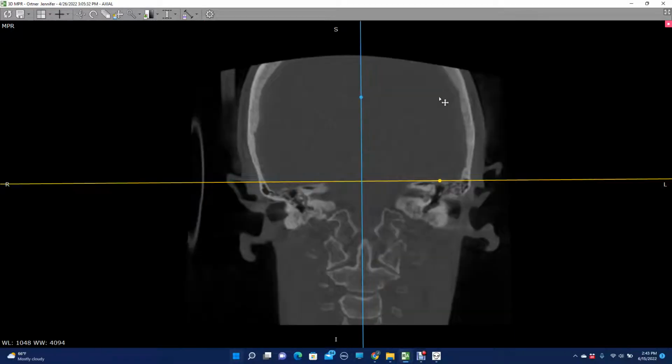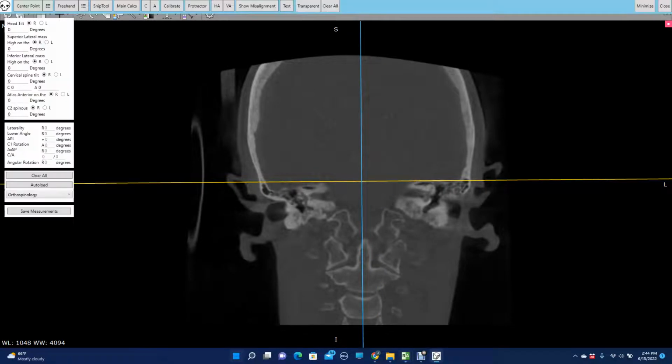And if I double click here, it brings this one to full screen, and this is where we will pull up the toolkit, drop a vertical angle, and try to measure the amount of head tilt. The way I built these tools is that you can drag the points around and measure very quickly and easily. Okay. And it looks like her head is tilted to the right side by 0.56. So if we enter this into right 0.56, we have our first measurement of head tilt.